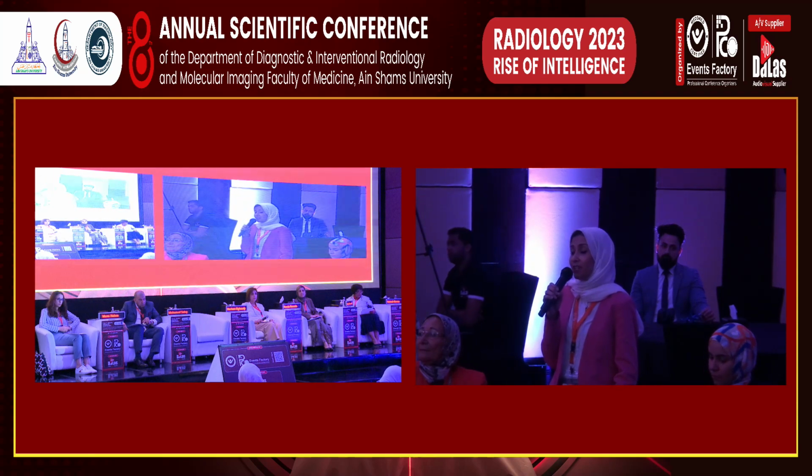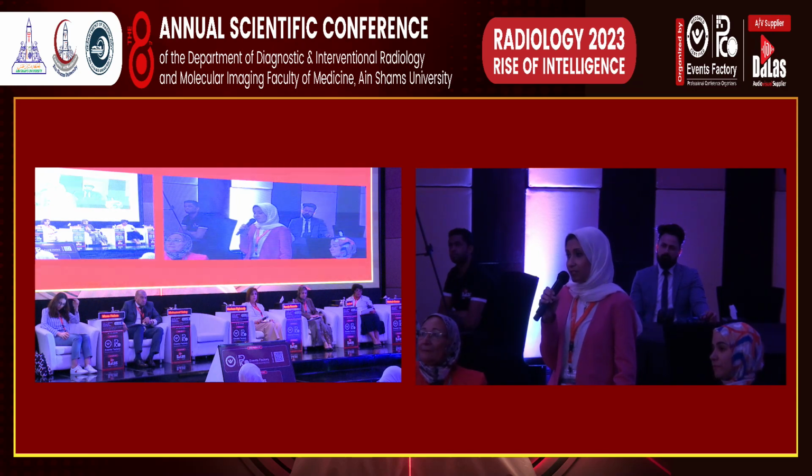فلو انا عارفه ان التيومر اللي انا بتعامل معاه في الاساس ده نون اف دي جي افيد، يبقى انا الفيوزد ايمج هيضللني جدا لو اعتمدت عليه لوحده. لازم هبص بقى على السي تي علشان اقدر اطلع الباثولوجي فعلا فين موجود، واطلع الحاجات اللي فيها الفايندنجز وافيد بقى العيان. يعني لازم اديله في الاخر ريبورت مش بس ان ما فيش اف دي جي افيد ليجنز، لا لازم اطلع له ريبورت بكل الليجنز اللي موجوده سواء اف دي جي افيد او مش اف دي جي افيد.